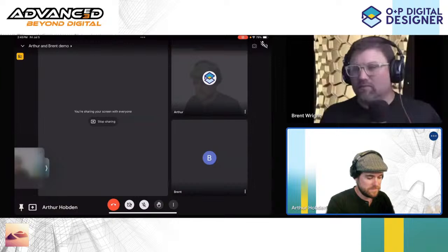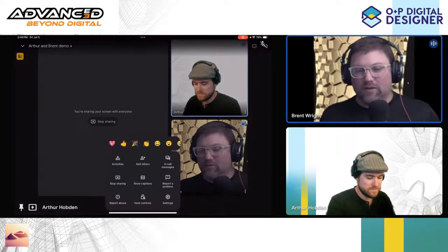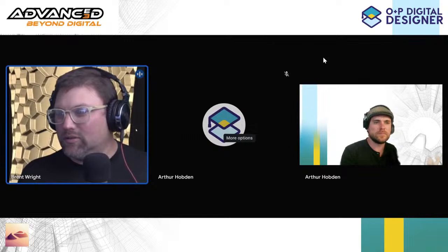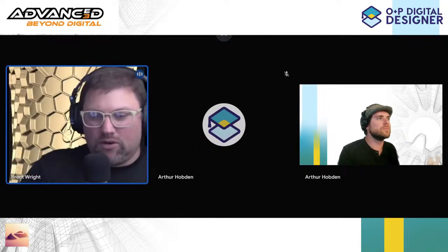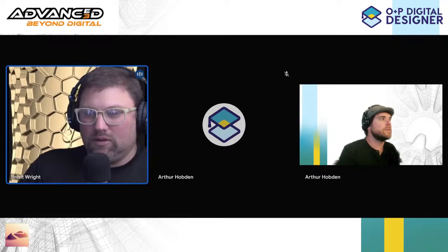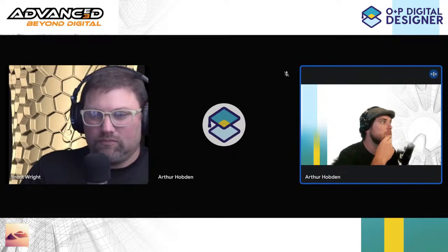How did that feel? That's very cool. I like the zones. I like being able to do that. What are your options as far as measurement in Sculpt? It's limited. It's only direction, like point to point measuring right now. That's the one thing it doesn't do very well.